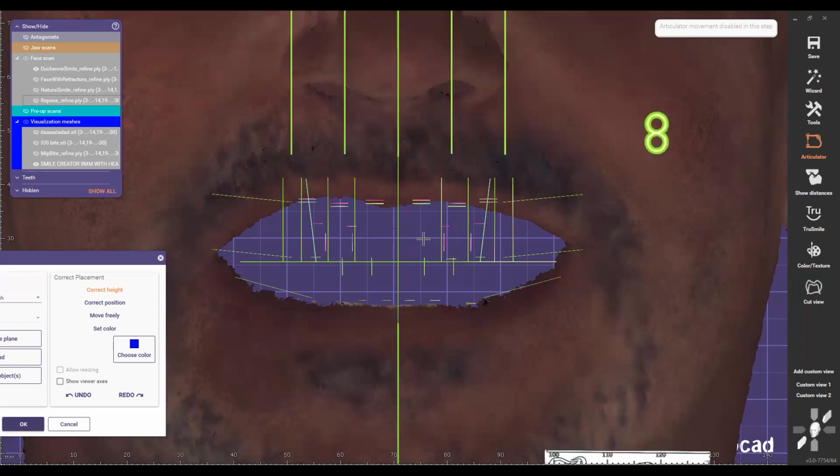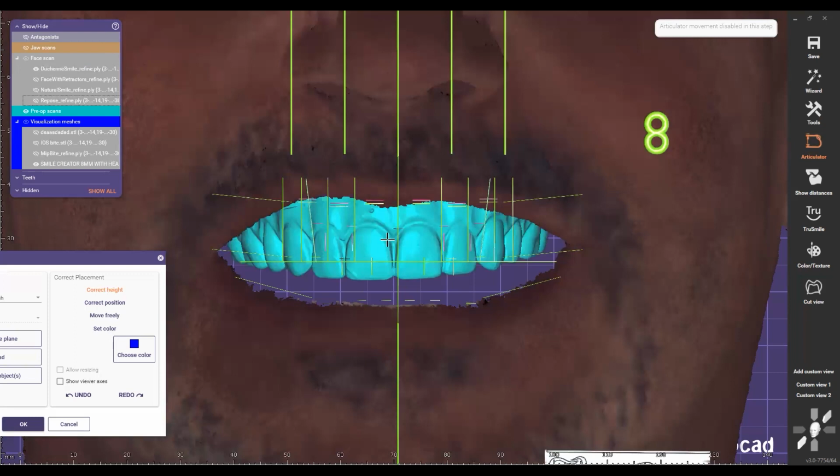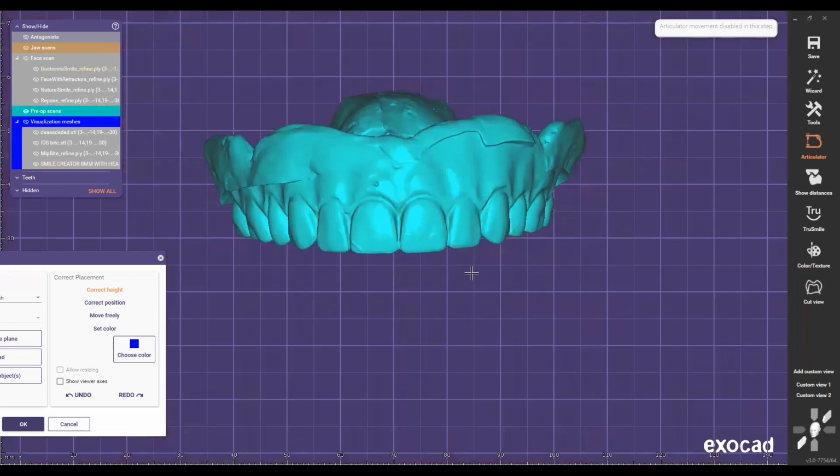And now these cases are fun, because I know what I'm doing, because I learned from my mentor how to do these cases. So now we have this, because if I don't have the facial scan, this is important to know, and this is what happens in dentistry right now. We just get this denture, and the doctor's gonna say, oh, just follow the denture. That's the first thing they're gonna put in the lab slip.